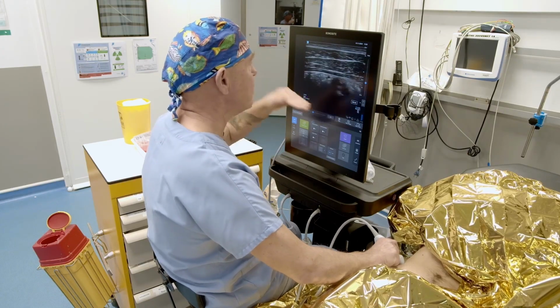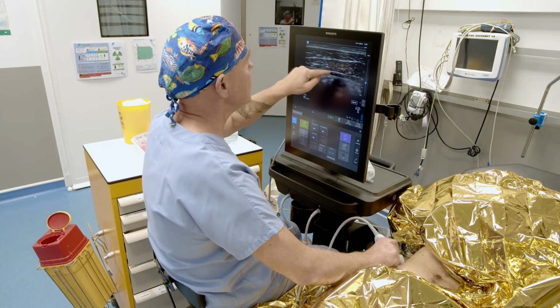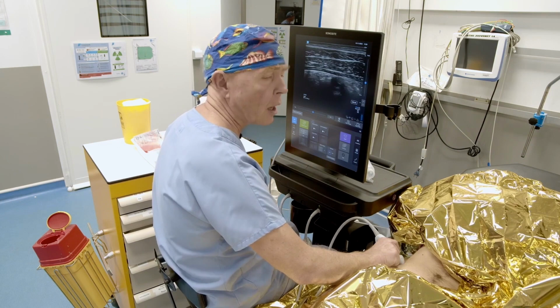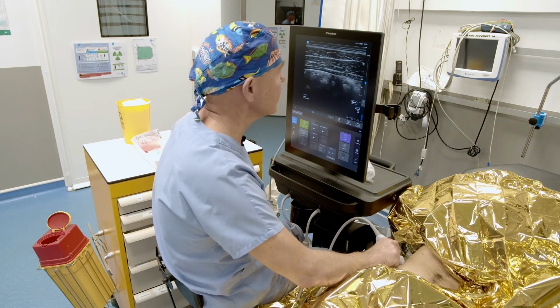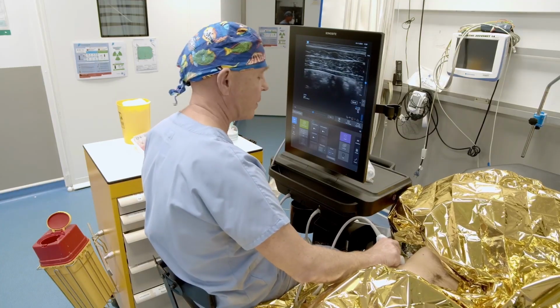So start from the inside and don't go 1, 2, 3, but rather go 3, 2, 1, and then your diffusion site will be between the second to last structure. This sometimes helps avoid confusing it with a layer of fat.